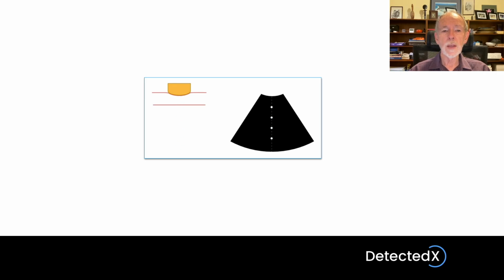The other thing which is less obvious is that as the ultrasound pulse is travelling backwards and forwards through the soft tissue between the probe face and this reflector, it's going to be scattering from the soft tissues. And so the soft tissues are also imaged repeatedly. So we'll have both the tissue interface and the soft tissue between the two reflectors repeated again and again in the image, although they'll gradually become fainter due to attenuation, of course.